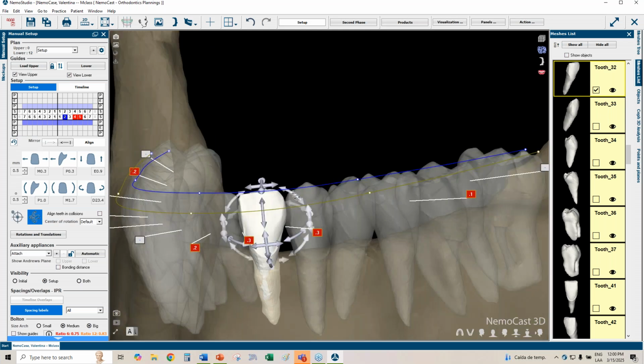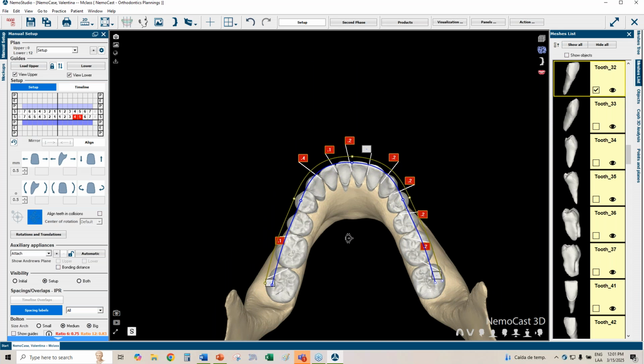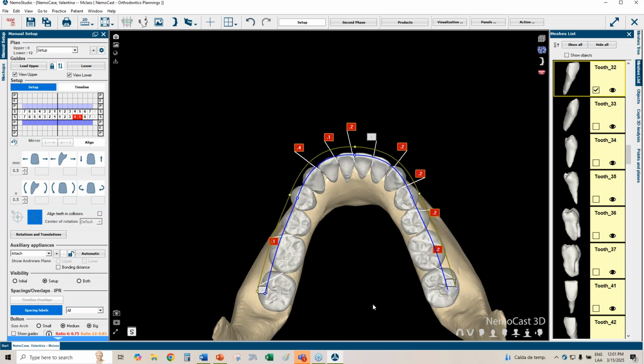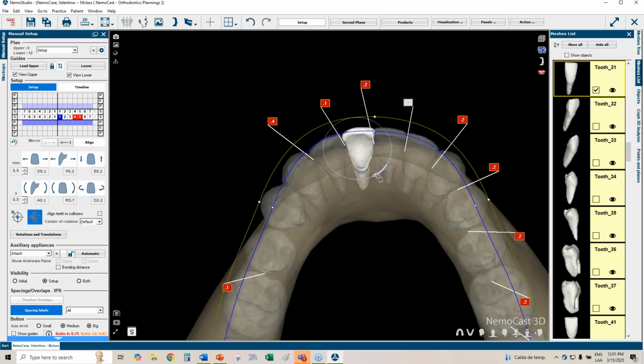And this is all going to account to how I want to perform the treatment as well. Okay, so that's going to be better at the end, right? And we still have the same spacings. We just redistributed everything into a better position, right? So this is going to help us achieve good therapeutic.